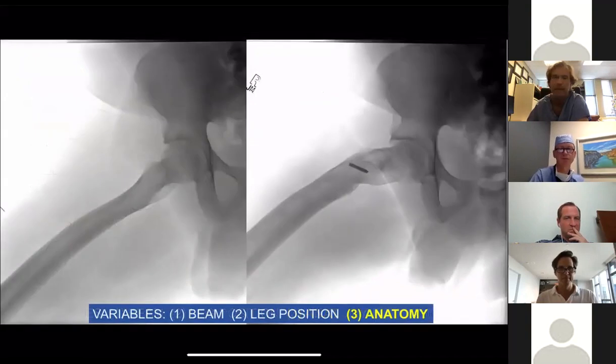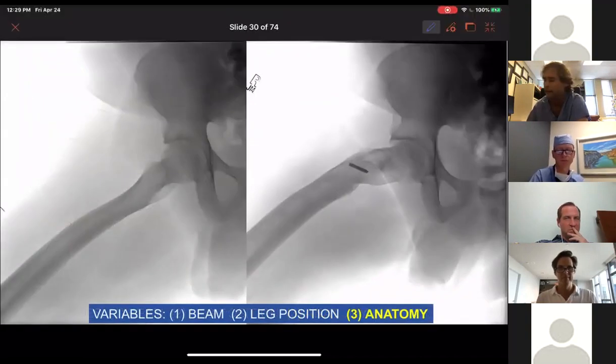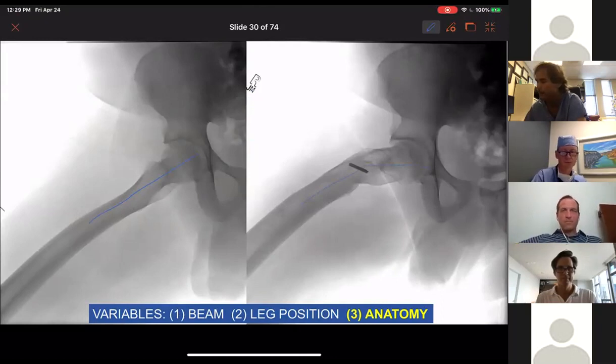All right, so we can take a case like this, and we can say, all right, this is this patient's normal. This is a standard collinear view of the proximal femur. And we can see not only does he have a flexion deformity or a retroflexion of the femoral neck, he also has a retroversion issue of the femoral neck, right? So this is a patient that had a slipped capital femoral epiphysis that there was an attempt made to fix with a Southwick procedure, which is a subtrochanteric osteotomy. It failed. So he got a double deformity. But you can figure that out if you understand what normal anatomy is supposed to look like. And the other side is super helpful, as you see here.